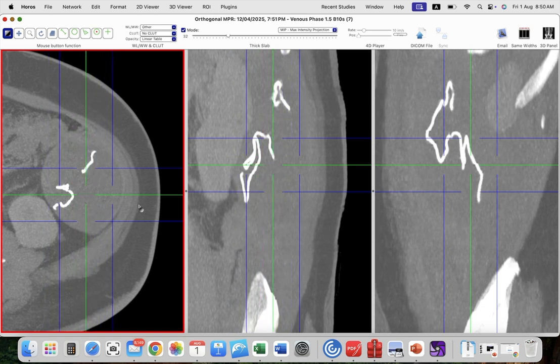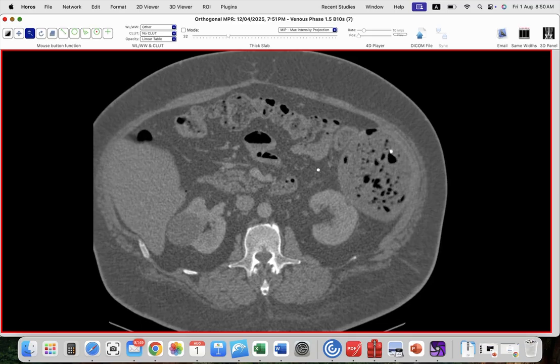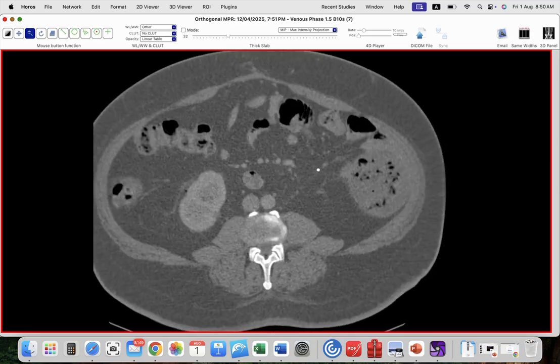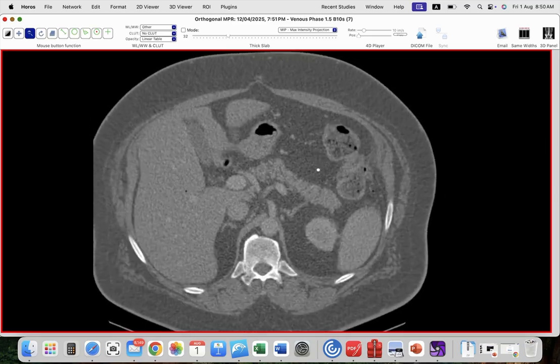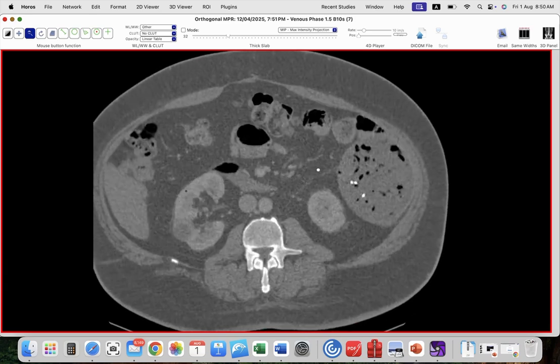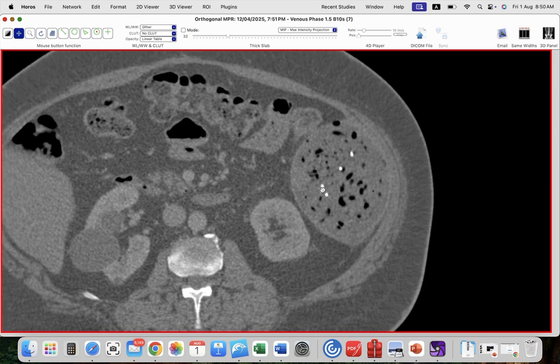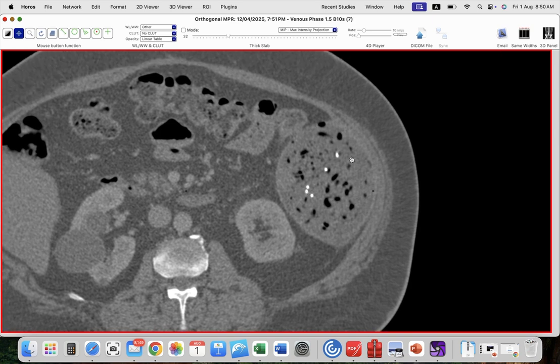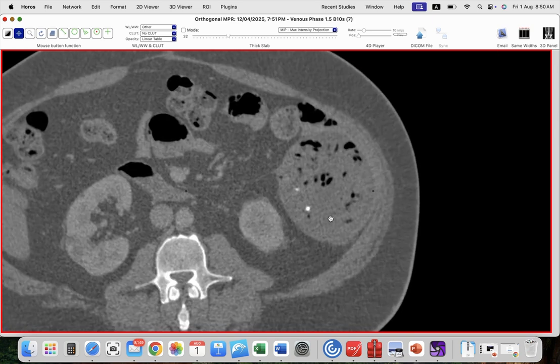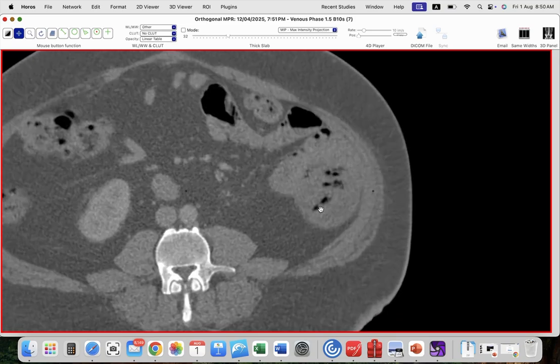And you should be familiar with this appearance, because once you see it once you will always remember it. Structure well defined, filled with heterogeneous air foci, and an internal linear marker is a missed towel.